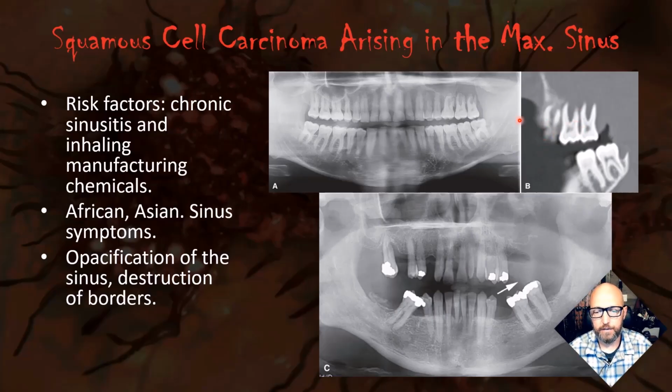Here's a cone beam CT of the same case. We really have the teeth floating in air. This looks so much like a case that I saw where the dentist did not diagnose it because they didn't know how to diagnose cone beam CT. And it was really sad because it should have been treated a lot earlier in the patient's life, but within just a couple of months, it had expanded all the way up into the patient's orbit. Very poor treatment, I think.